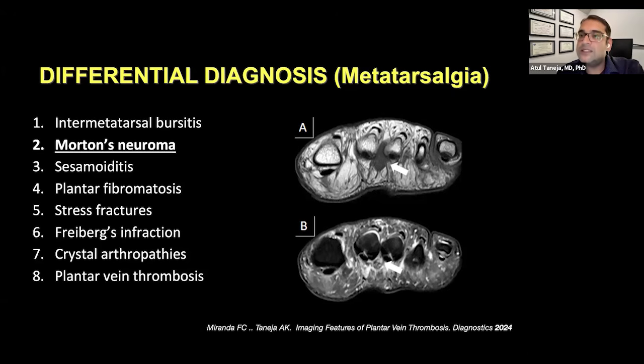This is a classic one, and you can see how different it shows from the plantar plate. Even though it's large, you can tell it's right at the median aspect of the intermetatarsal space. Plantar aspect, median aspect. It's not skewed to one side or to the other side. On T2, some edema, you can see how thick the interdigital nerve is, but remember, use T1 as your best friend for neuromas, all right?